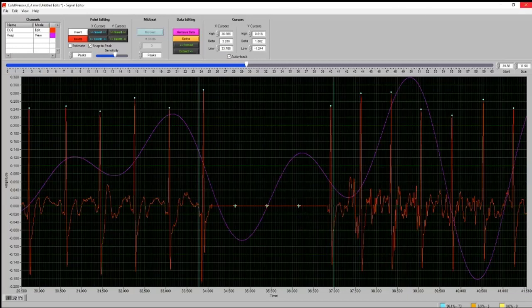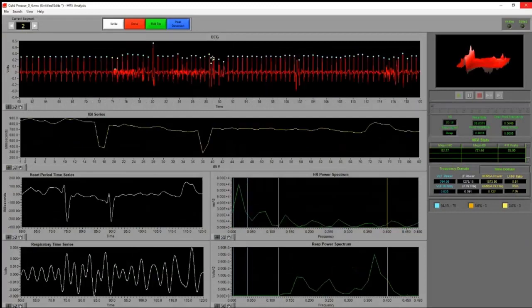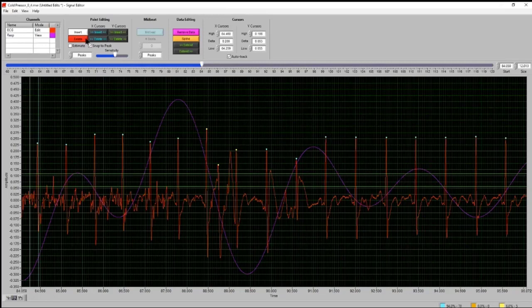Okay, so that is really, what if we continue on here, we're going to have more of these motion artifacts, removing this information, and I'll go ahead and show you this one last artifact, but in essence, that is fundamentally what we're trying to do here.